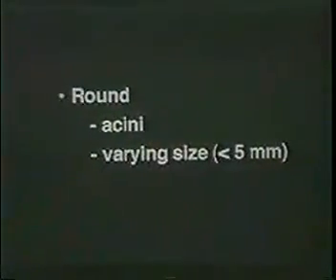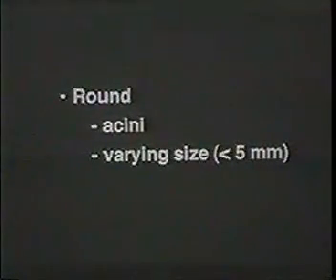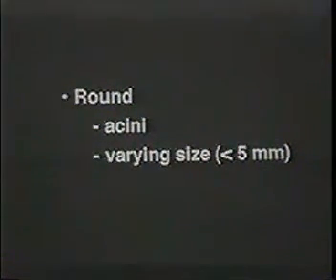There are round calcifications that occur in the acini, and these calcifications have typical features, but we can't always tell that they're benign. But when they're typical in terms of the geographic distribution, they're not biopsied. In this case, because they were clustered in groups and in only one part of the breast, they were biopsied. But the case provides a nice example of their round shapes.